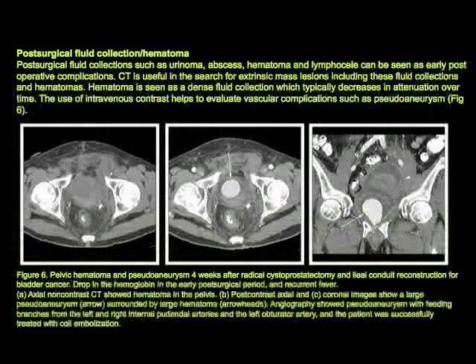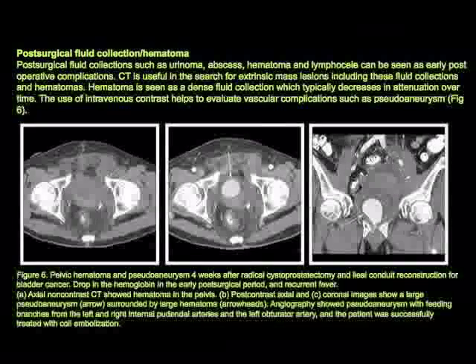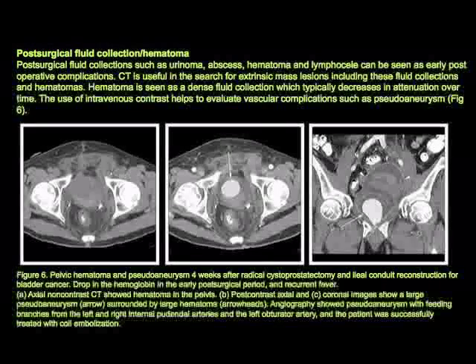Another case, post-surgical fluid collections. Now in this case, we thought there was a hematoma present. Hematomas, seromas, urinomas are all possible complications. But when we gave IV contrast in this patient, look at that marked enhancement. That was a great case.